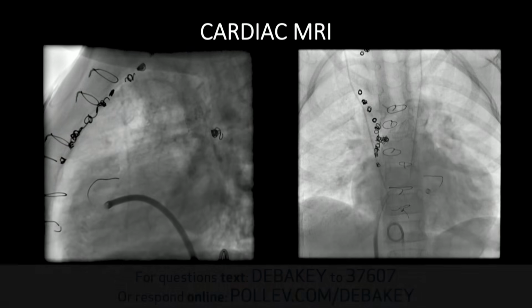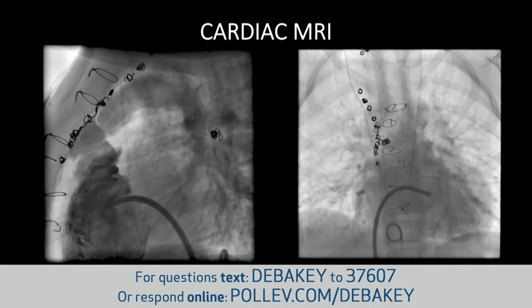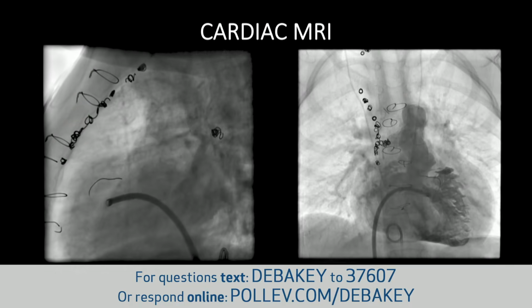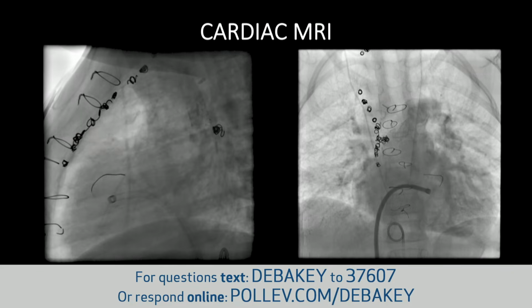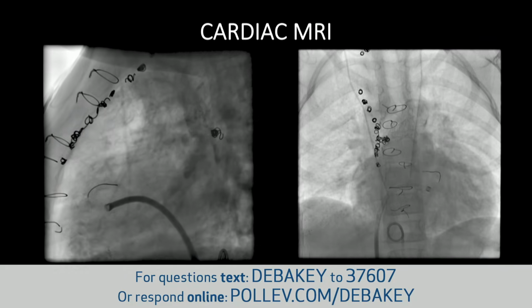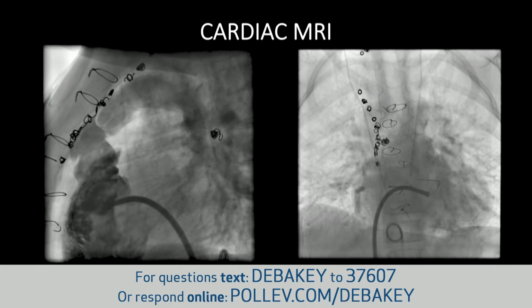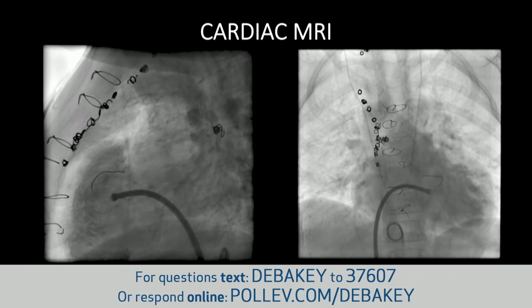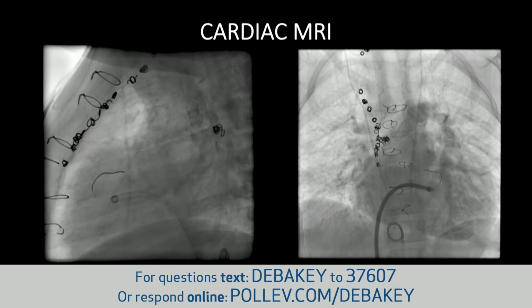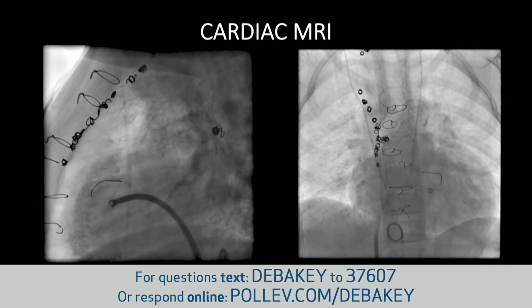But if I show you this coronal view, I'm sure you'll agree with me if you look at it a few times, that even though there is flow up that conduit, the PAs are very abnormal, and there is very limited flow to the upper lobes of both lungs, right? In spite of a stent there, the flow to the lungs is very limited.